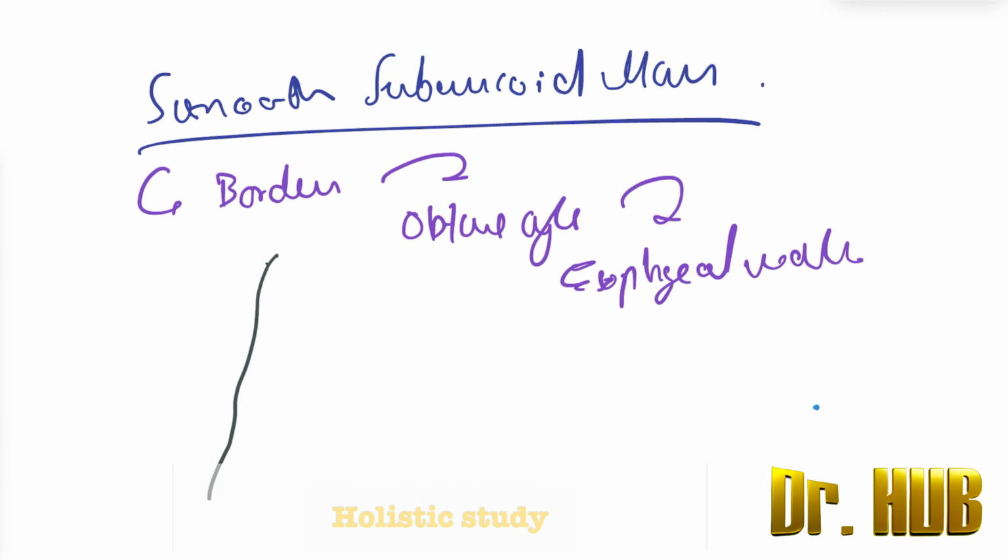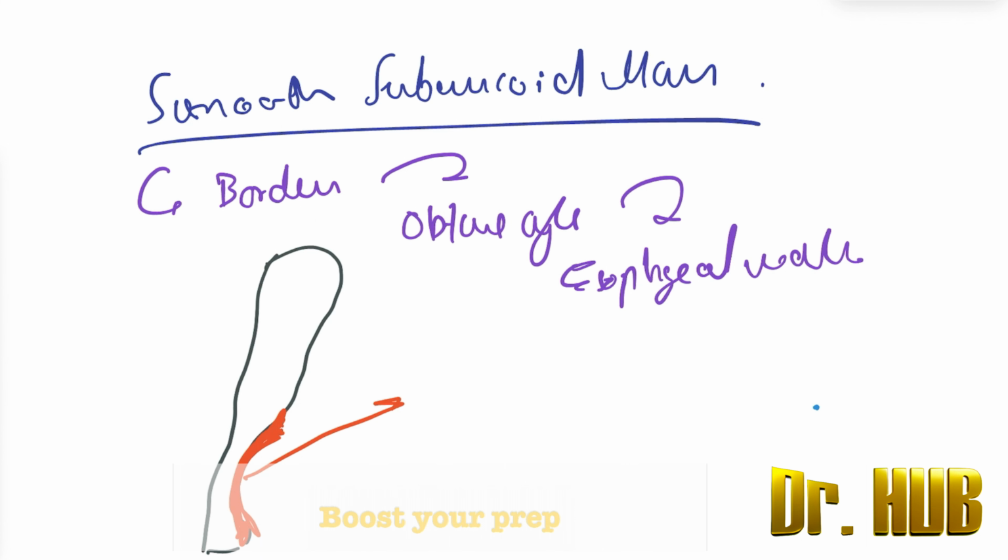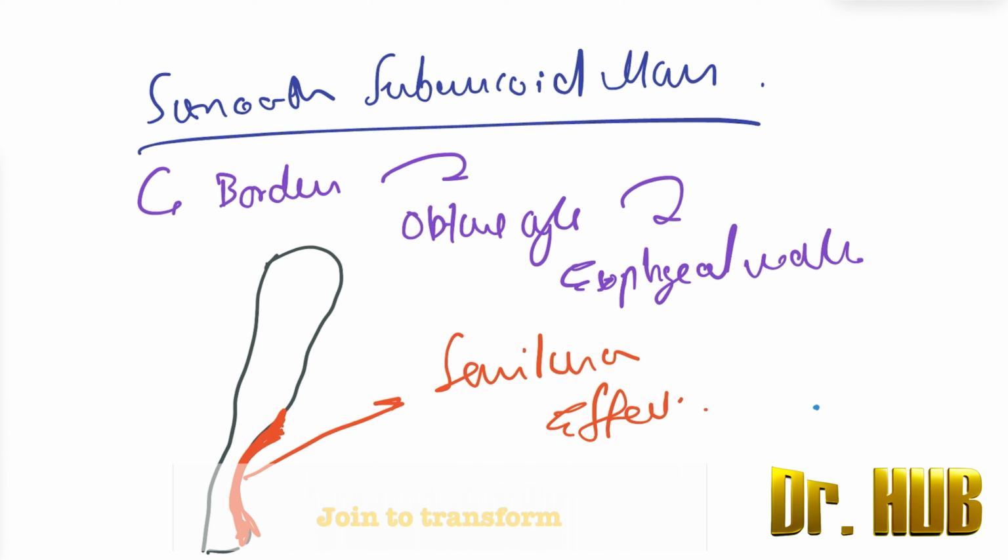Basically it goes like this. This is nothing but the semilunar filling defect. So this was about the barium swallow.